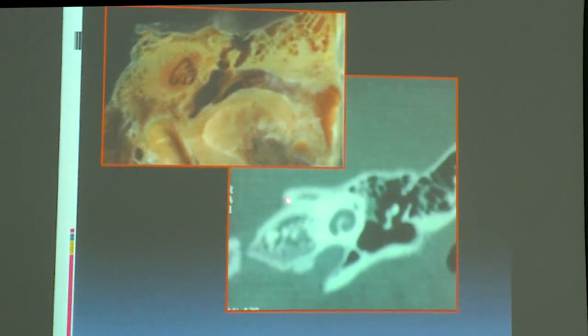We can just appreciate the beginning of the internal auditory canal here. So if you correlate, you can see the cochlea. This is the internal auditory canal region. Obviously, this is from this side, this is the external auditory canal region and you can see the malleus from here.